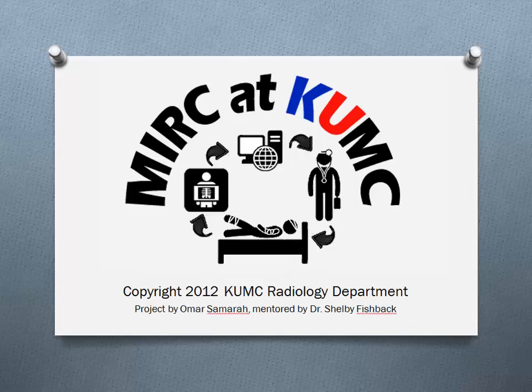Welcome to the tutorial on annotating images. One of the easiest ways to learn from radiological images is to view an image by itself, guess its significant features, and then reveal the answers. This is usually accomplished through annotations, and MIRC has a built-in feature for that.